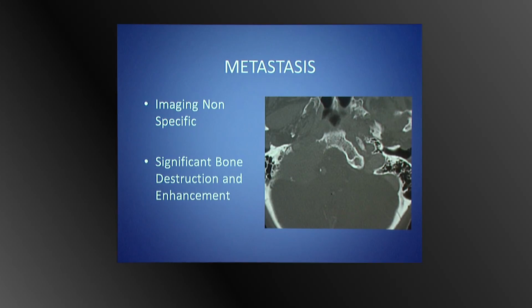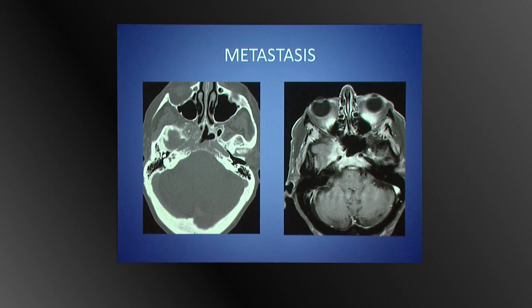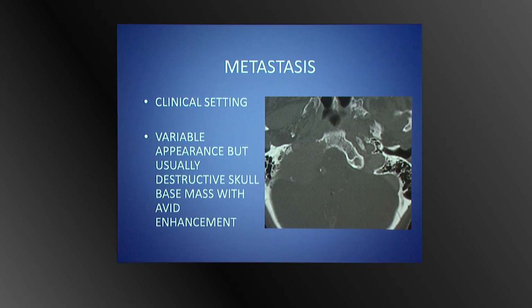But like metastases elsewhere, there tends to be a destructive entity with avid enhancement, and it just comes into the differential, as we know. But as I've shown, these tend to arise outside the apex and spread to involve the apex secondarily, as most neoplasms do.